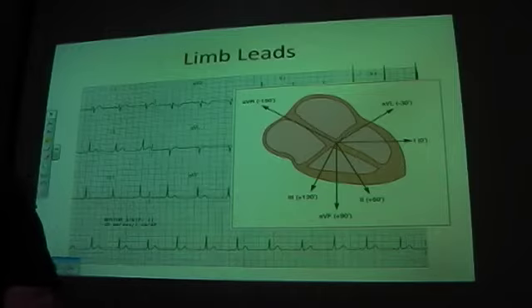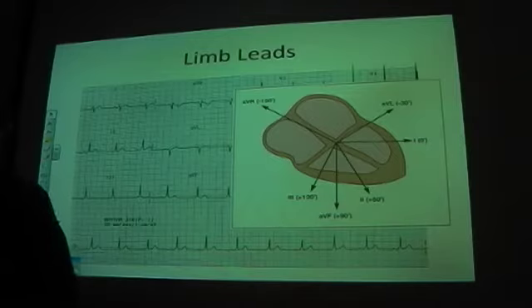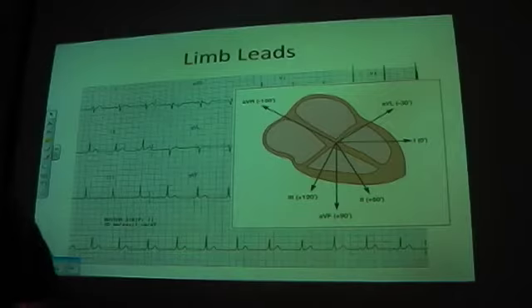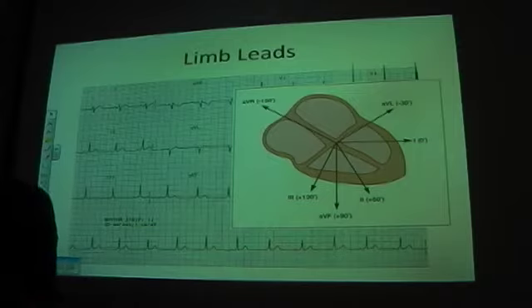When you're looking at these, 1, 2 and 3, they're all taking place at exactly the same time. So if you can see a P wave on one of those, then it means that there's a P wave on all of them, even if you can't necessarily see them. So you don't need to be finding everything in every single wave. And that's why they have this rhythm strip at the bottom, lead 2, and that usually gives the nicest trace. So if you can see things on that, then that means that you can find them elsewhere at the same time.